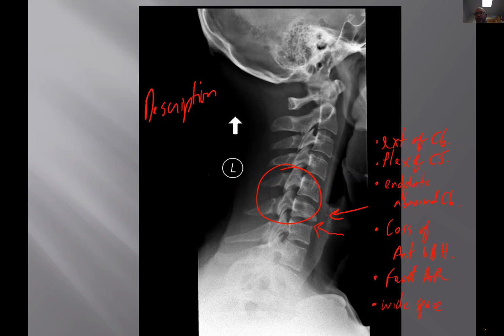So good, you guys got it, but I just want to remind you of the importance of old trauma. Focal flexion of a spinal segment in the mid-cervical spine, according to the literature, is very indicative of old trauma, as you guys know. The research has proven it out. Look for focal flexion, and of course extension the level below, which is absolutely right, will be indicative of old trauma. Okay? All right, good.